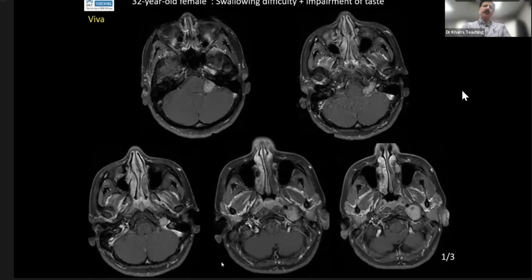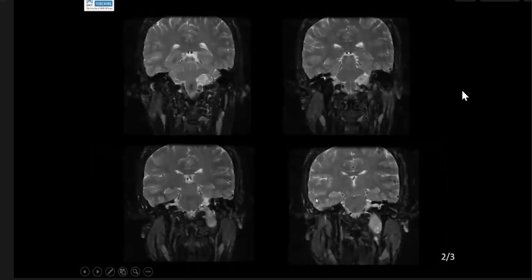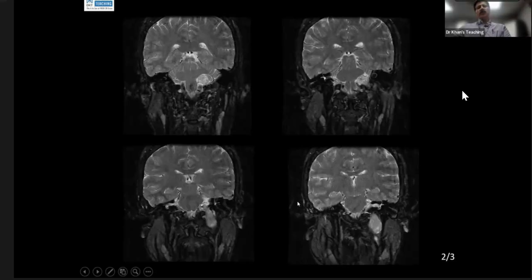So this is a tumor which is sitting in the jugular foramen. What is going to be your differential for this? So a neural tissue lesion, such as a schwannoma or a paraganglioma, but I don't see that salt and pepper classic flow void appearance to it. So I would probably say, because it's expansile and not destructive or osteolytic, I would say schwannoma would be my top differential.